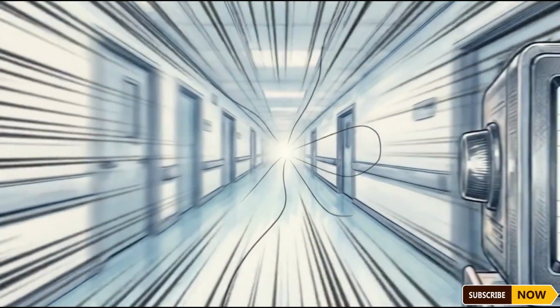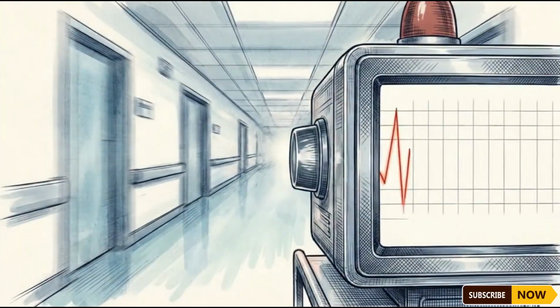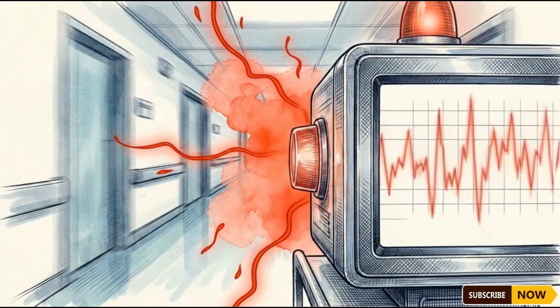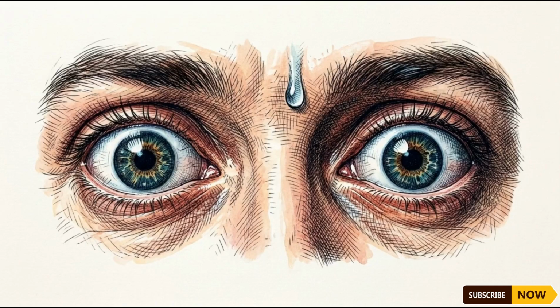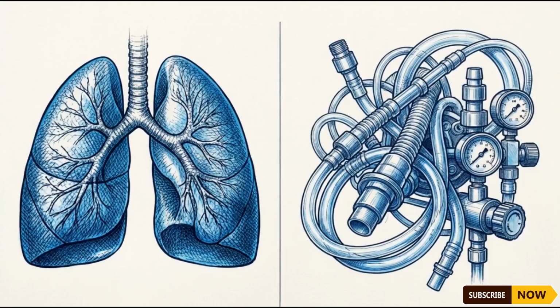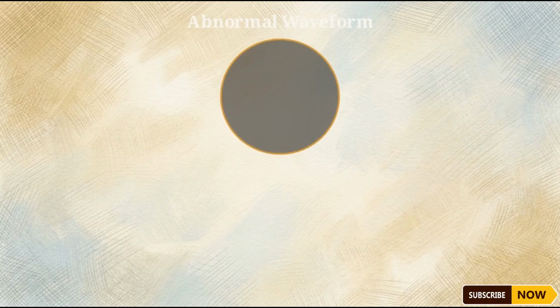The patient monitor suddenly throws up a jagged, unfamiliar line, and an alarm starts blaring. You have seconds to act. In that moment, you face an immediate choice. You need to know whether your patient's physiology is actively failing or if the life support machinery itself is malfunctioning. This flowchart breaks down the capnography dilemma.